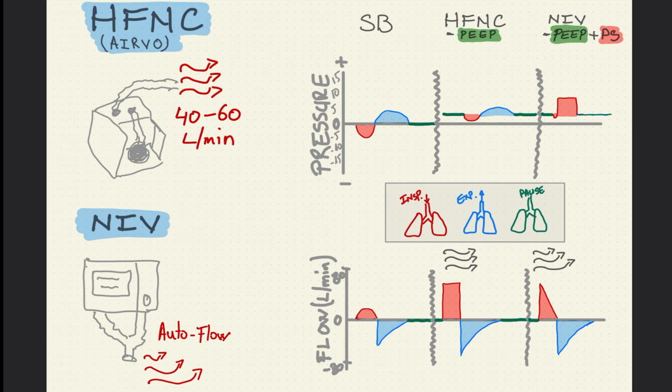As the patient's inspiration ends, the diaphragm relaxes and begins the expiration. The machine again adjusts the flow in order to allow the patient to breathe out. This flow is then readjusted in order to maintain a set positive end expiratory pressure.